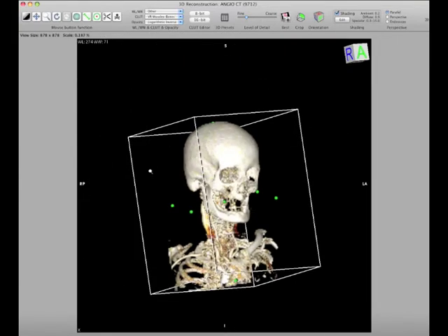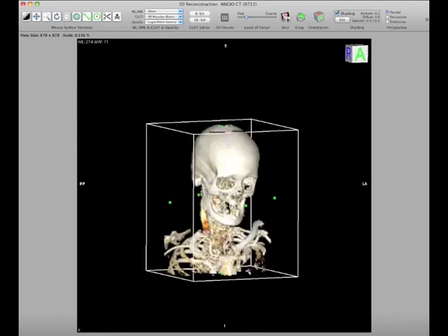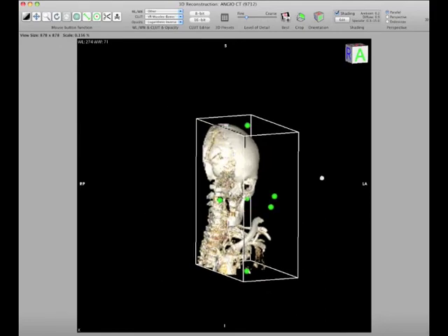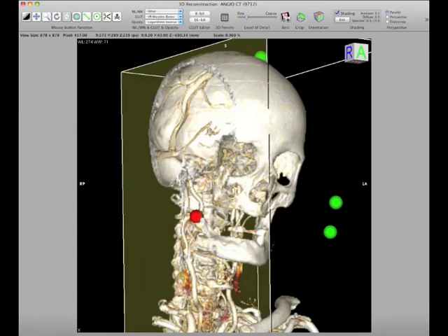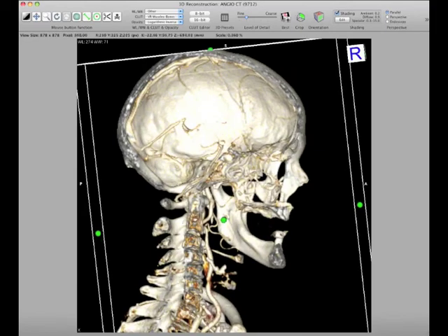In addition to this, we can also use the crop tool, which will load a box, which looks like this, around our object, right? And that box, if we grab these little green things, we can move in here and make sections around it. And so that's the straight sinus right there and the great vein of Galen. We position this so we can see into the vertebral canal.